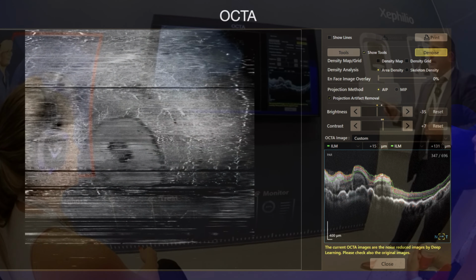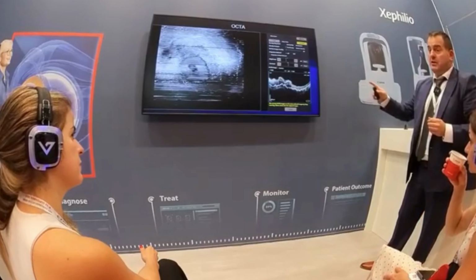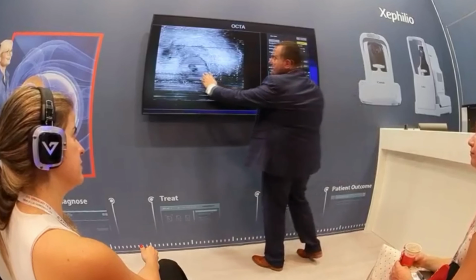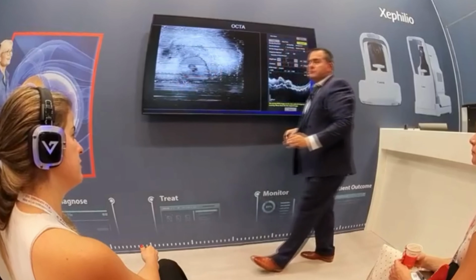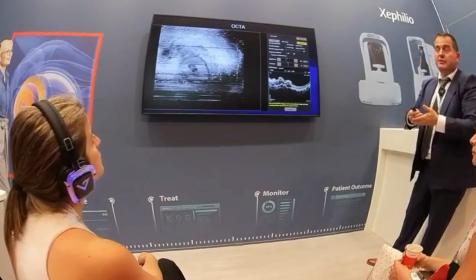Again, this is even OCTA imaging in this eye, which doesn't have a central fixation because of the hole, and anyways correctly depicts that there are no vessels in the graft and there are superficial vessels which can be detected even through the silicone which is there.